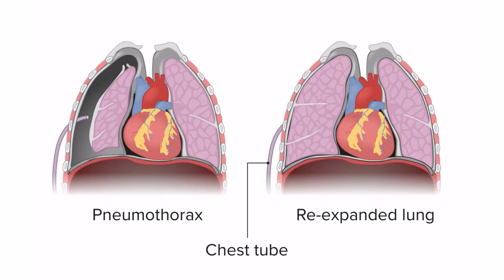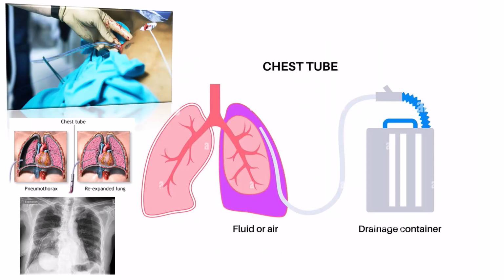When a patient has a pneumothorax, the physician will normally place a chest tube to reinflate the lung. If it's small, they might not use a chest tube because it will reinflate by itself over a period of time. But it is important that you take images before and after the tube placement. Here we see the chest tube placement, the pneumothorax, and the re-expanded lung. For technique purposes, notice that it is best to get an inspiration and an expiration chest so that we can get the differentiation in the lung markings.